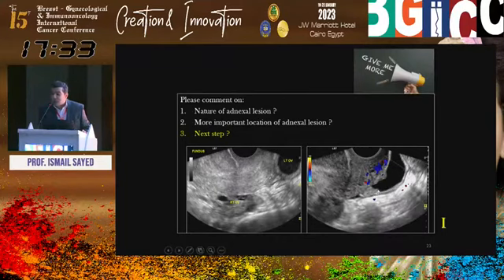What is this structure? Endometriotic nodule, yes. If you're suspecting pelvic endometriosis or peritoneal endometriosis from the classic standard transvaginal ultrasound, you have to complement. Look for other foci of deep infiltrating endometriosis along the bowel, along the urinary bladder, along the distal ureter, and so on. So this was endometriotic nodule.